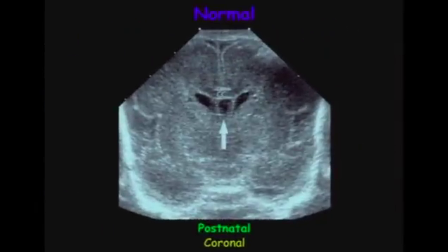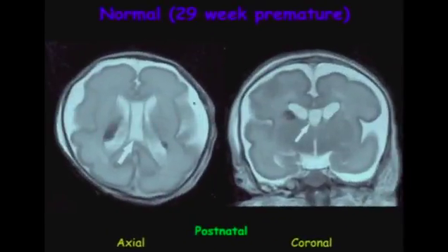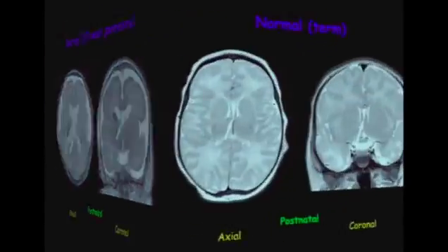In a postnatal ultrasound, we see the corpus callosum, we see the two clear walls, and here's the cave. Here's a premature infant, and so it's much bigger because the cavum vergae is still making up the bulk of this. So it goes all the way back. This is not a high-riding third ventricle or an interhemispheric cyst. This is just the CSP, a vergae.